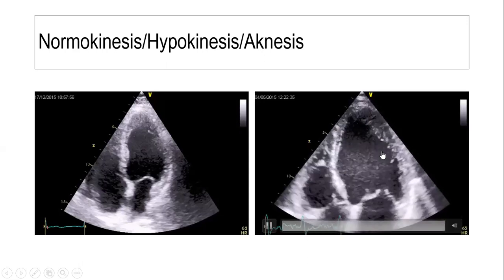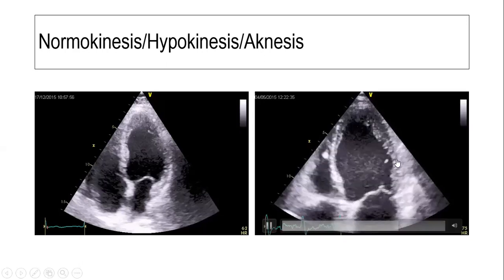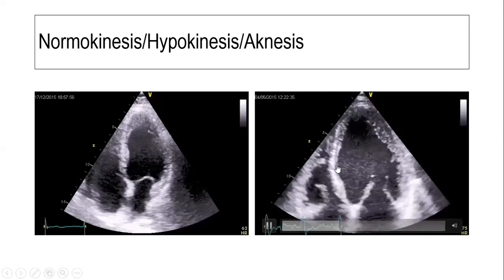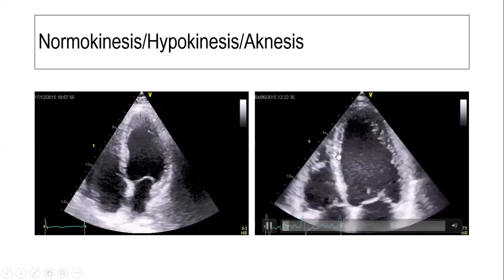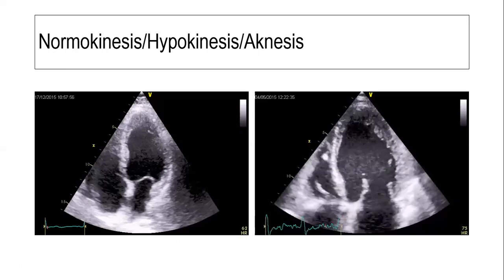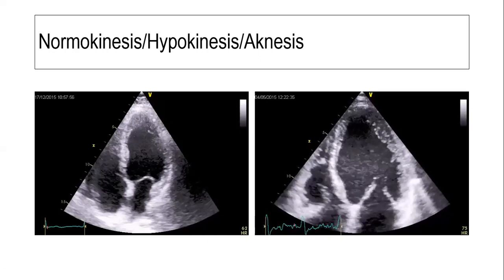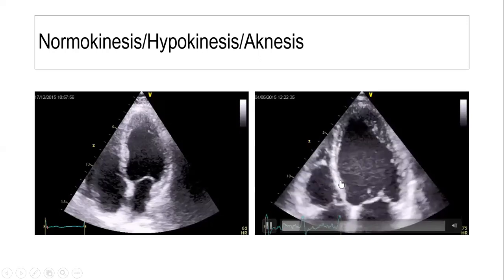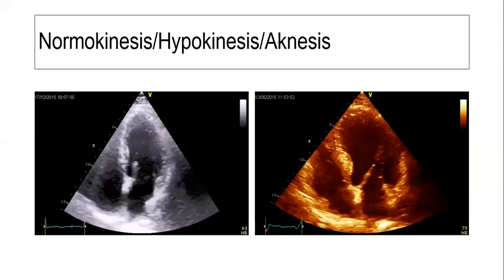And this is not only in apical segments. This is apical septum, apical lateral, mid-lateral, and basal lateral, where some non-compaction is also seen. The non-compaction is gone in the mid and basal septum completely. This is a very classical depiction of non-compaction of LV with associated coronary artery disease. And this mid and basal septum is almost akinetic. Look, it's not thickening, it's showing just movement. Yes, sir. All right, let's move to the next segments.